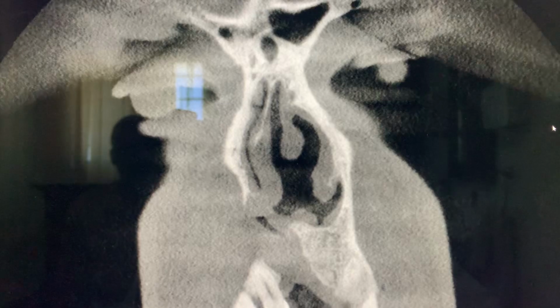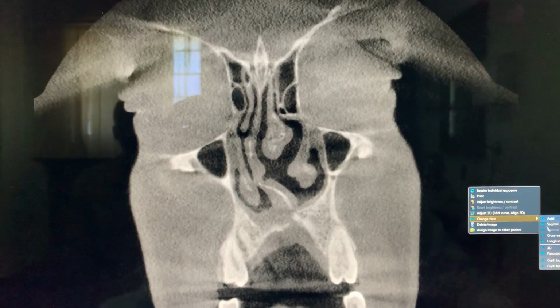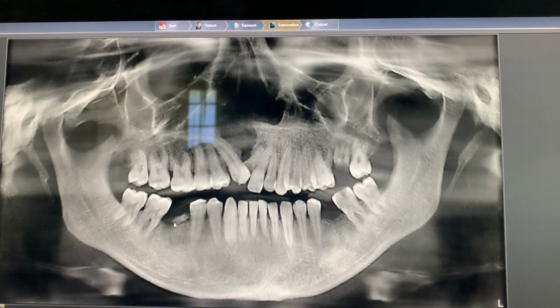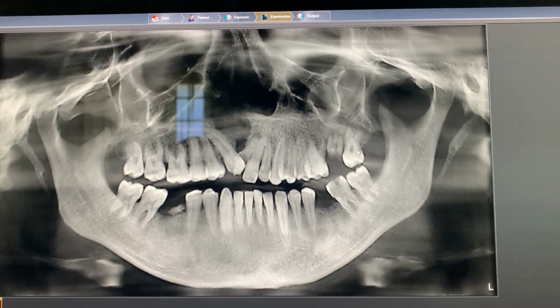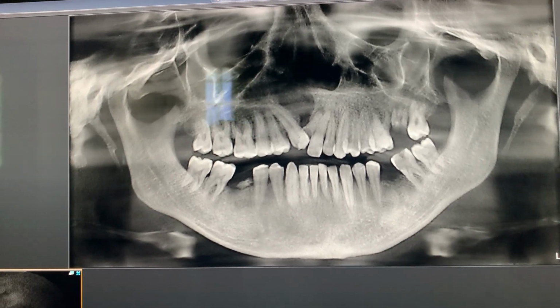It's very essential that when patients need these kind of face makeovers or multiple procedures on the face, that a thorough examination of their CDs be done. This is the orthopantomograph. So there's a root stump here. This is not of much consequence for us, but this is. So we're gonna probably take it off much before we do the anterior maxillary distraction. And I'm gonna move on to the next view now.